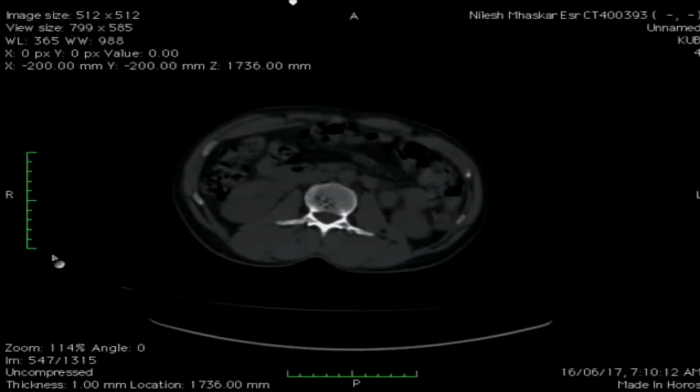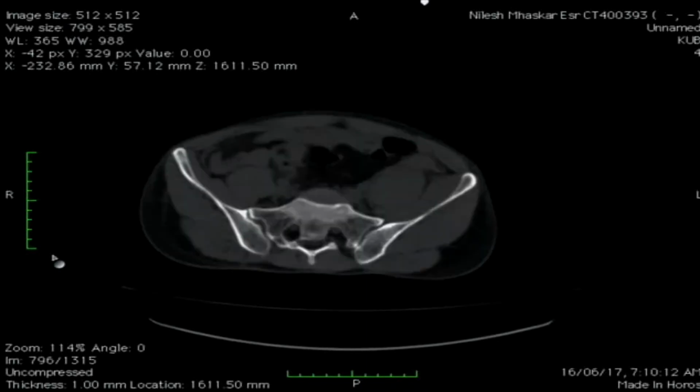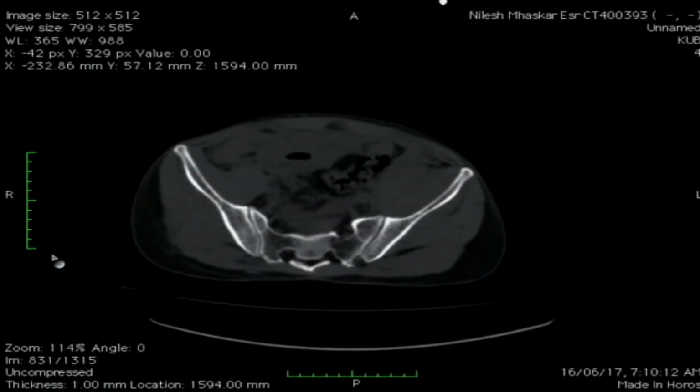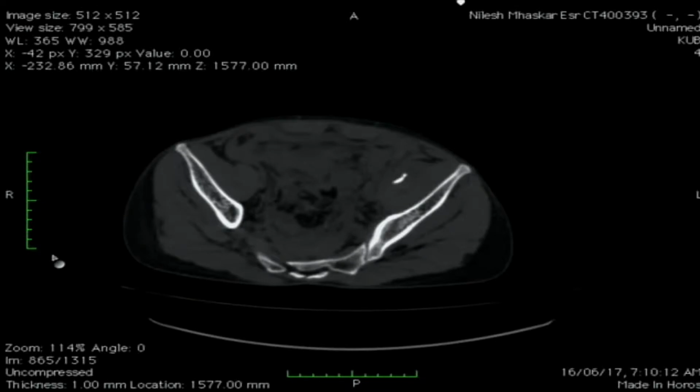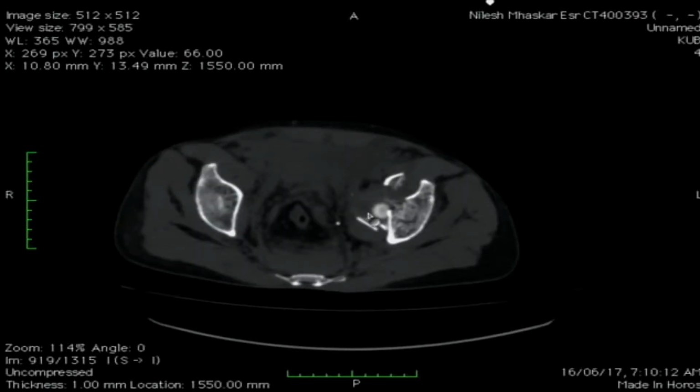So this is basically a 2D viewer. The 2D files are loaded in this, so once I scroll, I can see them. Once I scroll this CT scan from up to down, I can see the plane in which the CT scan was acquired. So I am getting the 2D images on this, which is still better than seeing them on films.